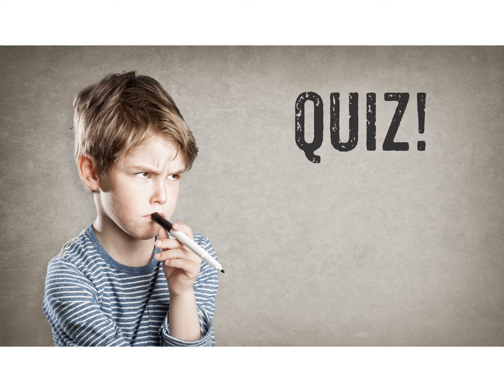All right, it's time to apply everything you've learned. Do a quick quiz. So we're going to show an image. You need to say what the view is and whether it's positive or negative for free fluid.